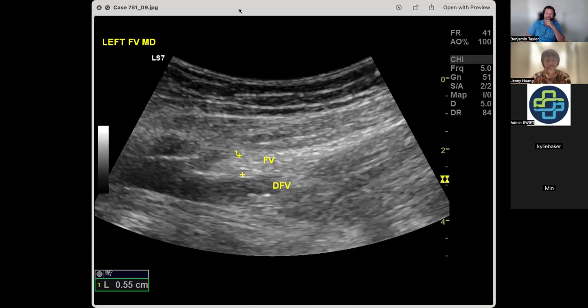And that actually is one reason why I recommend all people with DVT should get a scan at some point at the end of their treatment, because pretty much guaranteed at some point, I guess maybe if they're 99 years old, but at some point they're going to turn back up. Someone's going to be asked to rescan them and have to try and work this out. And it's really quite difficult if you don't have that old scan. So we did have the old scan and it said there was clot in the femoral vein before.